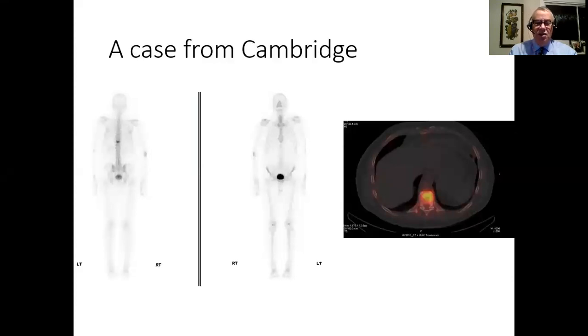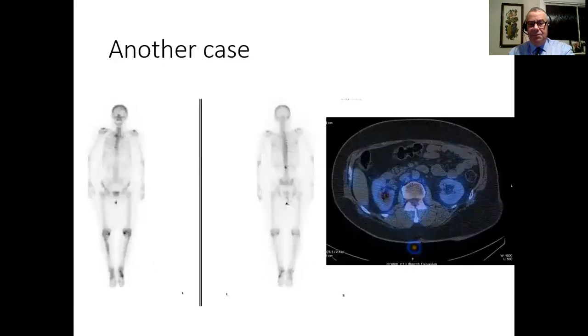So this is a patient who has, again, a spine with a single dot. It's actually more obvious on the posterior than the anterior, which makes you think that it could be to do with the posterior elements. But when you look at the SPECT-CT, in fact, this is a patient who's got a partial osteoporotic crush fracture. And that's why they've got increased uptake at that site. And it's not a metastasis or anything. Sometimes you get a surprise.